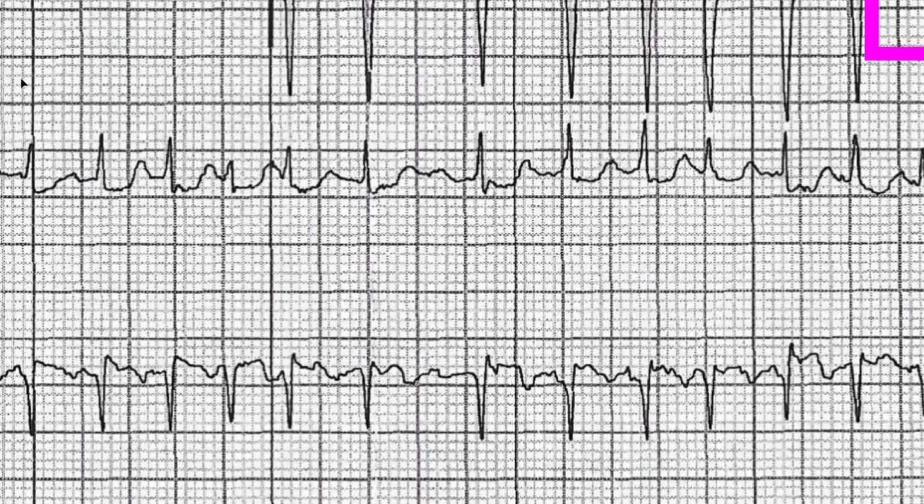Now imagine if you had a break, for example, from here to right here, and that baseline came across looking something like that. You'd be 100% sure you're looking at atrial fibrillation. However, you let that play out and the baseline starts doing something like this. Now you're dealing with probably atrial flutter. Or what if you get something like this? Now you're looking at multifocal atrial tachycardia. But you get the point, right?